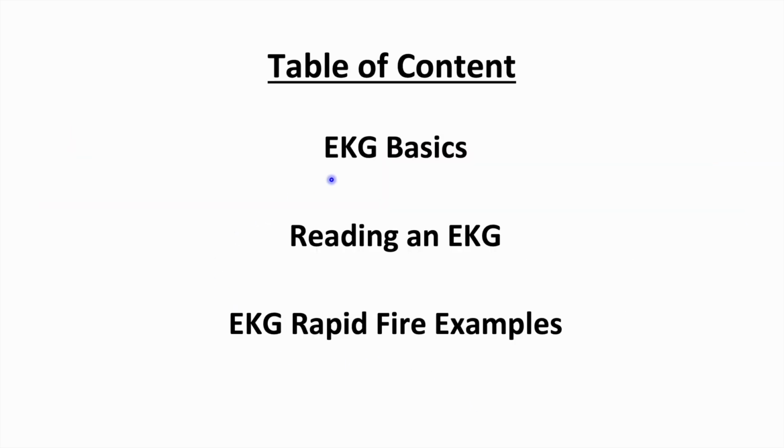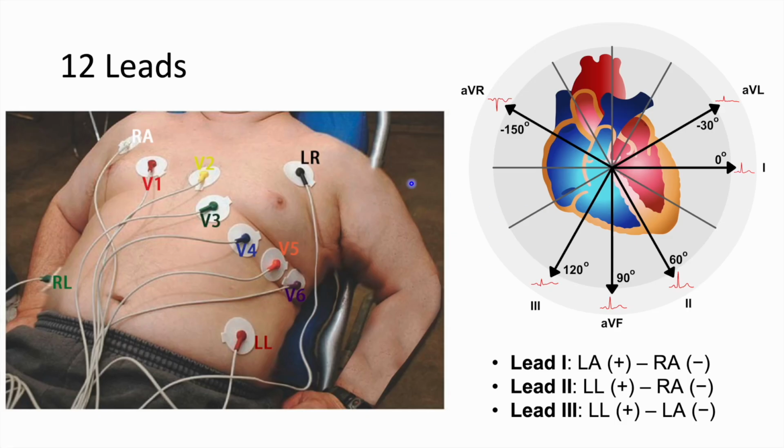The plan for this video is to go through the basics of EKG very quickly, how to read an EKG on clinical rotations, and then rapid fire examples that should be helpful for Step 1 or medicine shelf exams and stuff like that. So I'm not going to spend too much time going through the basics just because this is more focused on these two. But I will talk a little bit about it. So let's go through the basics first.